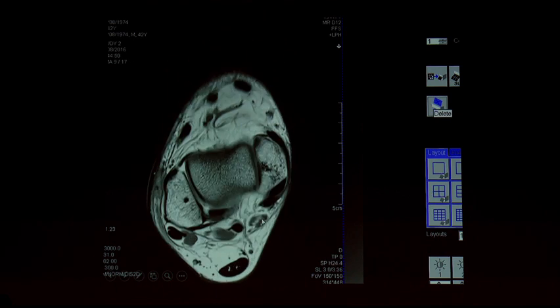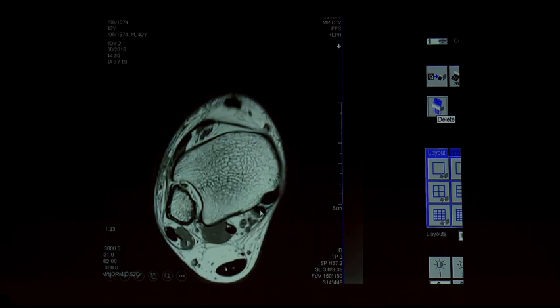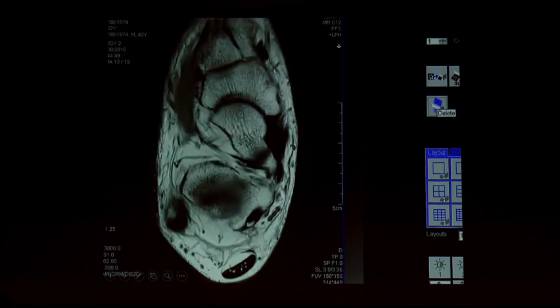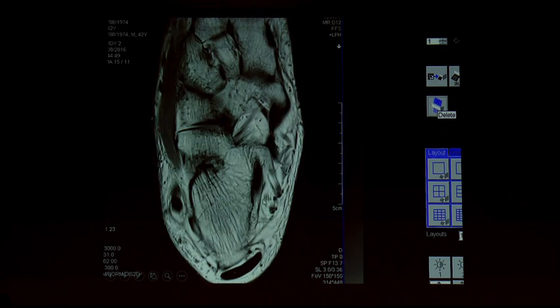So what is flexor retinaculum, which is formed between FDL and FHL? There will be a flexor retinaculum surrounding it. So the tarsal tunnel is formed. Important structures are vessels as well as nerve. And we have to carefully look at the tibial nerve over here. This is a very classical site. You can see the division of the nerve.